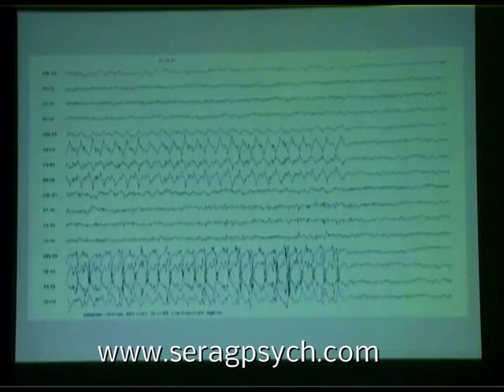Then it suddenly stops. Well, this patient was just jerking one arm or one leg during the thing, trying to have a pseudo-seizure. This is not a seizure. This isn't the way seizures look. So always, when you see lack of convincing evolution during the seizure, wonder if it's something else. And this patient was just feigning a seizure with moving an arm to create the artifact on the EEG.